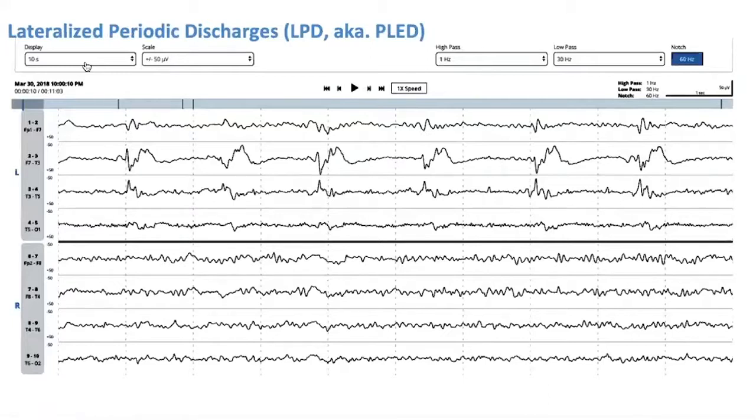You see across this section a recurring wave that's more separated. You're not seeing the suppressions that we saw before. You see across the right side that there's continuation of a relatively preserved frequency, maybe 10 hertz or so. That doesn't really matter, but because it's within the normal range and consistent. But on the left side, the top part, you see a wave recurring 6 times. And you can see the similarity of that discharge with each occurrence.